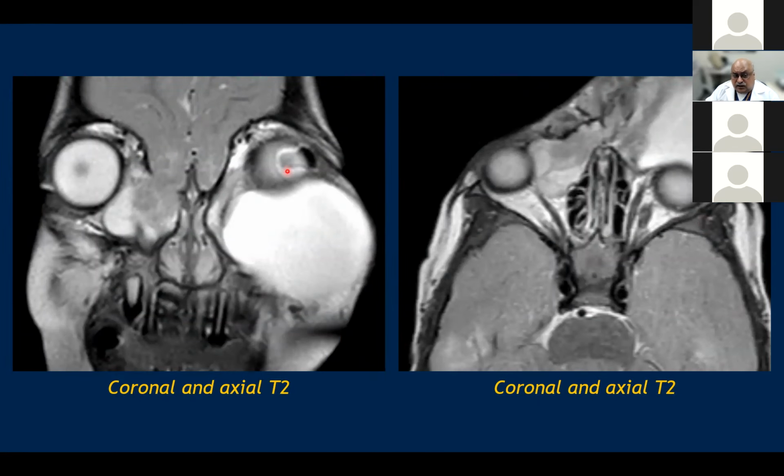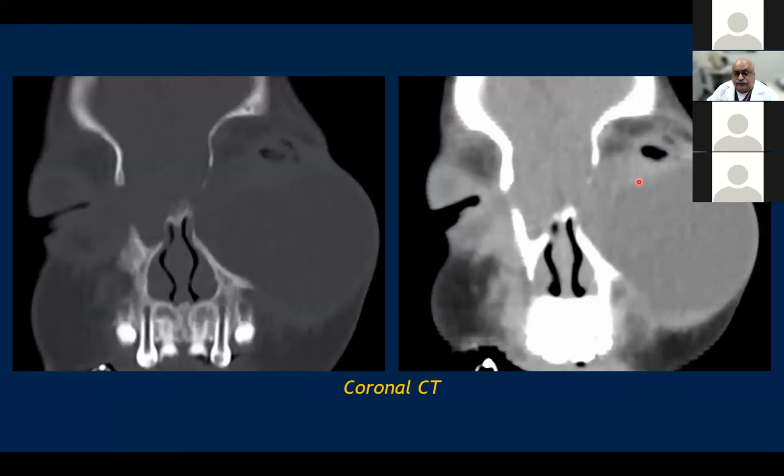There were large areas which were there. This is a congenital condition, so we can see that there is hardly any bone bridging the ethmoid sinus, and the entire brain herniates together with this cystic component with possible structures from the ethmoid. And there was this large component on this other side as well, which was actually emanating from somewhere in the lacrimal fossa.